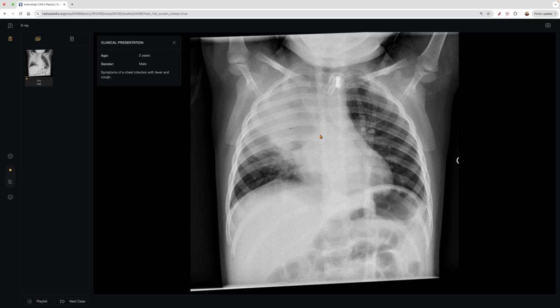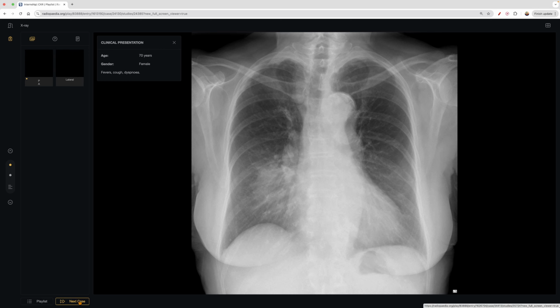And so remember, we had that image where it's like, is it right upper versus right middle? Or is it the superior aspect of the right lower lobe? And again, what clues us in is that you can't really see that paratracheal stripe here. So that'd be kind of losing that silhouette. And so let's get back into a systematic search pattern. Quick overall impression, you can see there's something going on here perhaps, but let's be systematic.